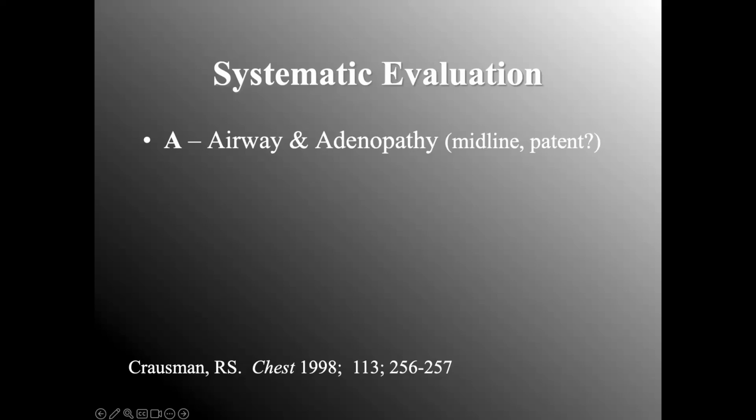Adenopathy would be lymph nodes. Do they have lymphadenopathy? In other words, look at the hilar region. That's prominently where most lymph nodes are noted on a chest X-ray.